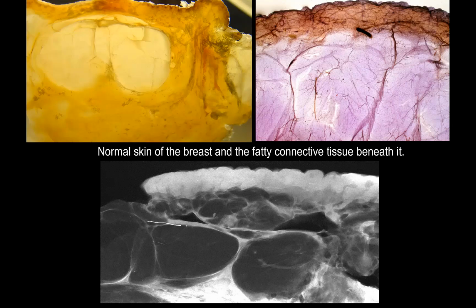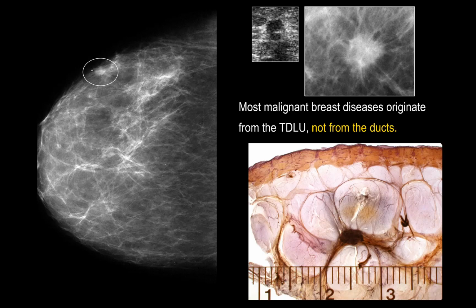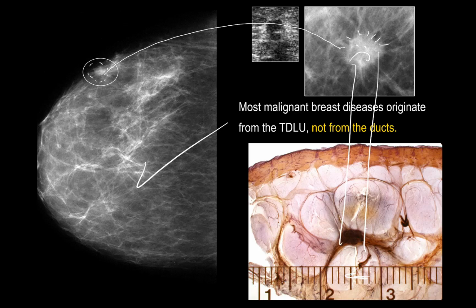I can see the superficial fascia outlined. This one called Cooper's ligament outlined. And I can find something that has a convex contour. And then we call her back and we magnify, and it says, I am a cancer. And it's just 3-4 millimeter. Very easy. If all women looked like this, we would not have a course.